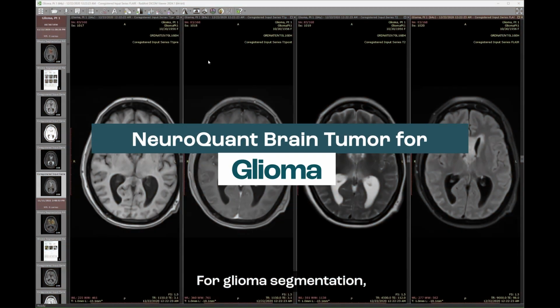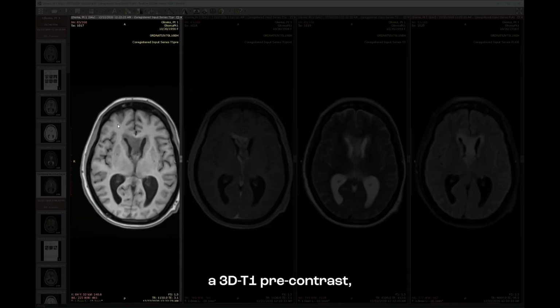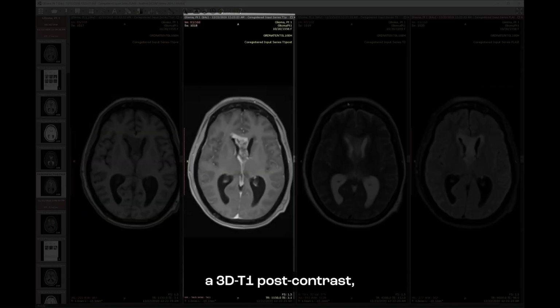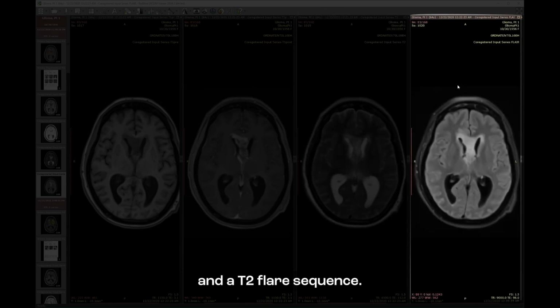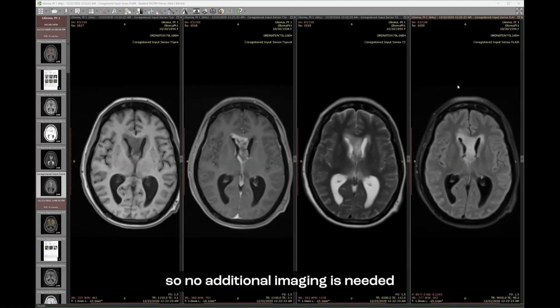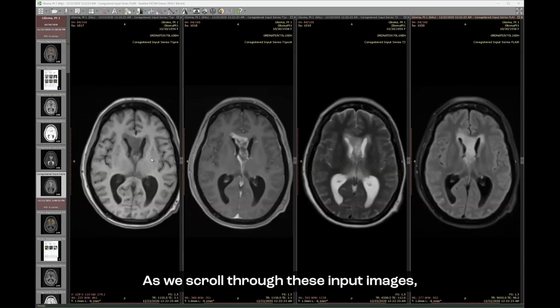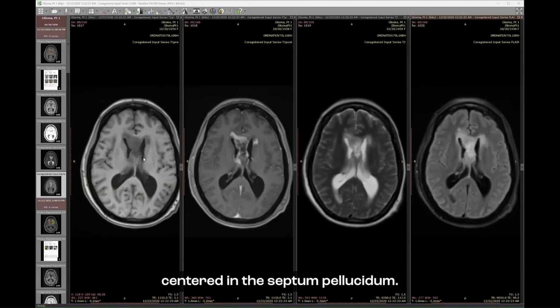For glioma segmentation, NeuroQuant Brain Tumor requires 4 input series: a 3D T1 pre-contrast, a 3D T1 post-contrast, a T2 weighted sequence, and a T2 FLAIR sequence. These are all part of a standard brain tumor imaging protocol, so no additional imaging is needed beyond what's in a standard clinical workflow. As we scroll through these input images, we'll see that the patient has a large mass centered in the septum pellucidum.